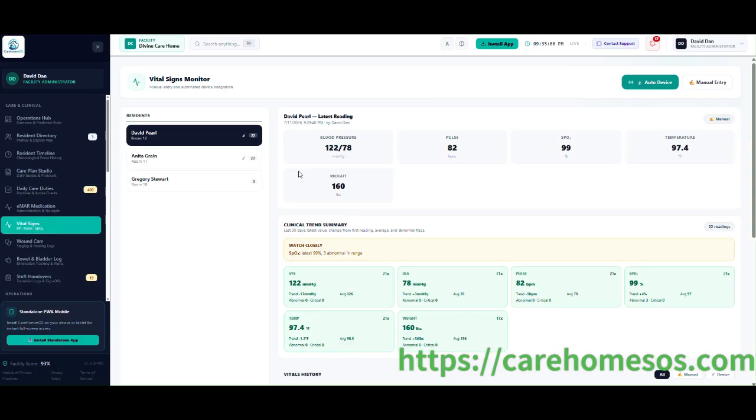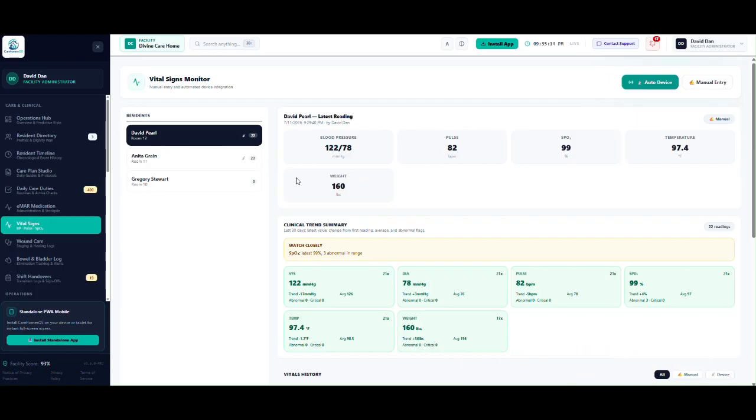In this CarehomesOS platform, we have many features, and in this video, we want to show you how to use the vital sign monitor. This video is for educational purposes, and every name or medical data that is shown here is for demonstration purposes. Nothing is real.